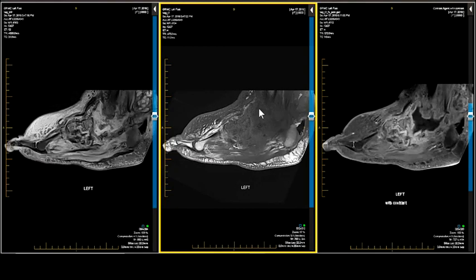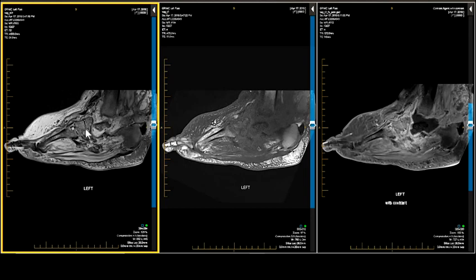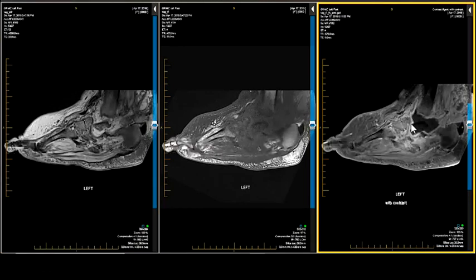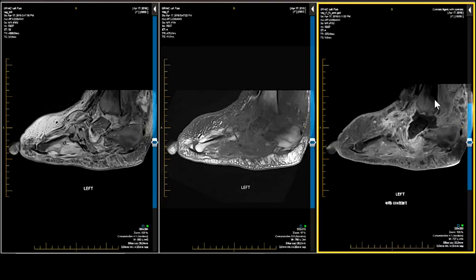So the question you have to ask yourself is, are the bones fragmented or are they destroyed? And then the next question you have to ask yourself is, does it really matter? Okay, I would say on the T2, some of them are fragmented. They're just shards of bone, and some of them are just wiped out. Like I can't even see the bone. So sure, the contrast made it a little easier, but all these bones that are wiped out, osteo. But that doesn't matter because the patient has this gigantic abscess and another one there. Their leg has to come off.